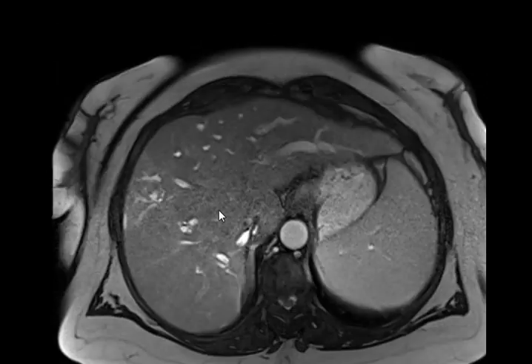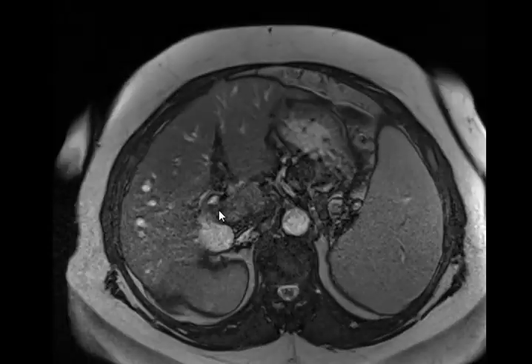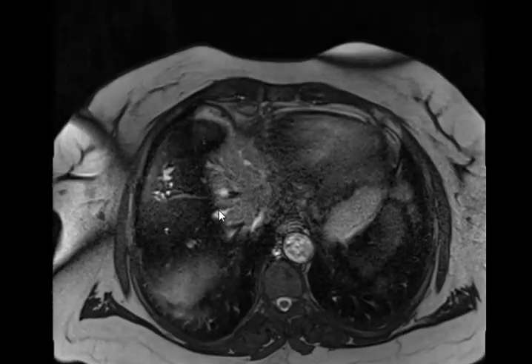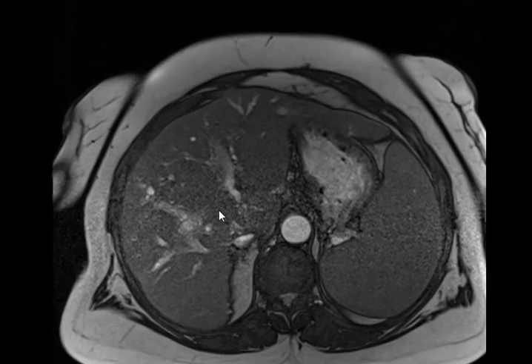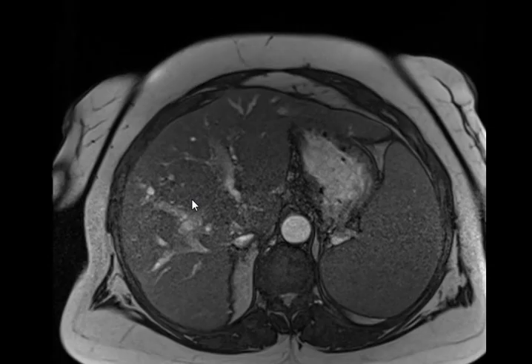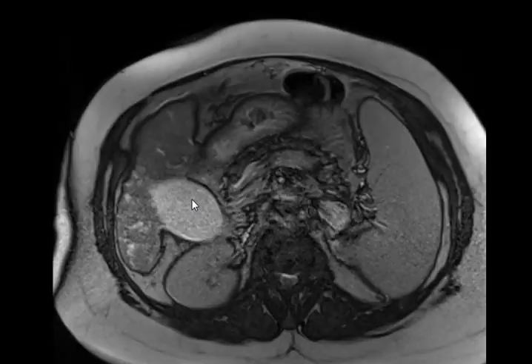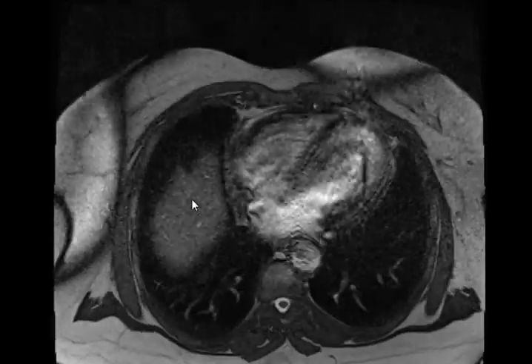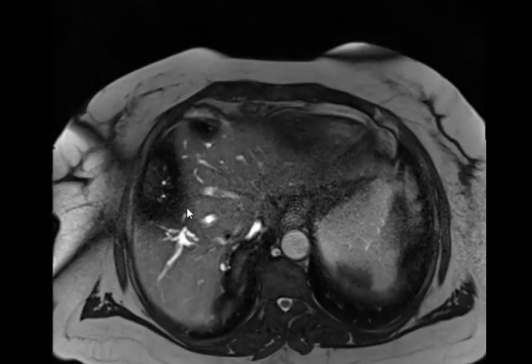Please do an abdomen MRI and MRCP and even give contrast if you need, and try to help me figure out what's wrong with this lady. So she came. We did an MRI. Of course, the echo pattern of the liver in the ultrasound, but it does not look like liver cirrhosis. So do an MRI and let's see, can we figure out what's wrong with her?